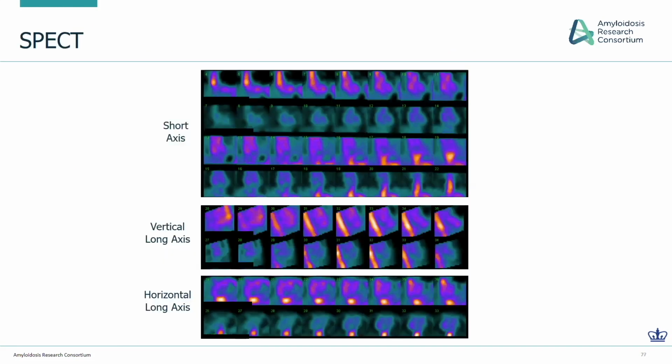Yep, and so she underwent a SPECT, which I think is shown here. You want to tell everyone what it shows? Right, on SPECT imaging, the line which you see coming from top to bottom, that's the sternum. You don't see any myocardial uptake, which is on the right of the sternum. So basically, it's a negative study. Is this a spot where the blood pool is occurring? Right, it's very minimal. It's really nothing to call it. Even blood pool, yes. Good. So a negative scan in a woman who's an allele carrier, and may be rescanned in the future, but requiring SPECT imaging given the presence of the breast implants.